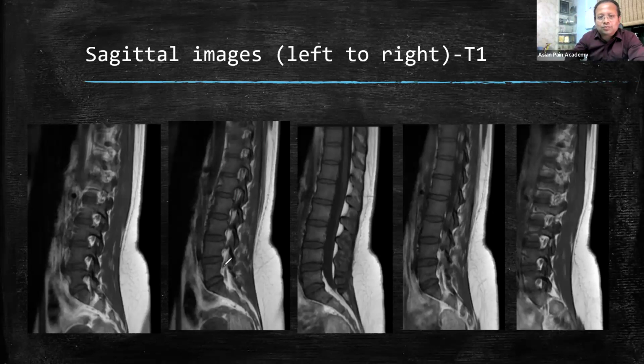Of course, this part is not there, but still it is nearly the body, pedicle only, pedicle level. Okay, here this is the foramen level. This is at the foramen. You can see clearly this is the foramen. And when you see the foramen, then you know you cannot see any spinous process here. Okay, this is the foramen level.